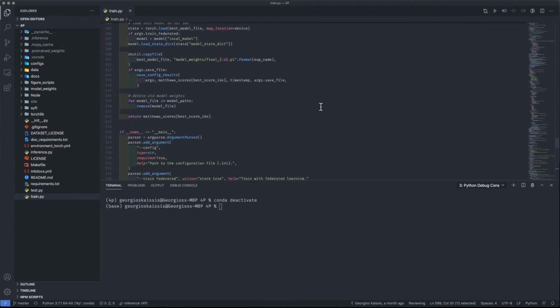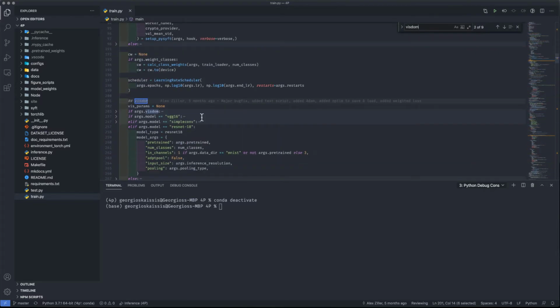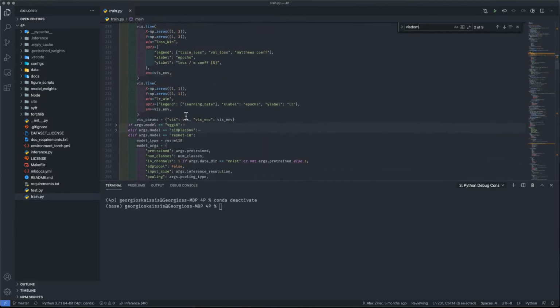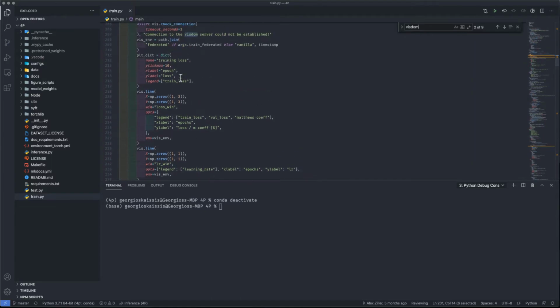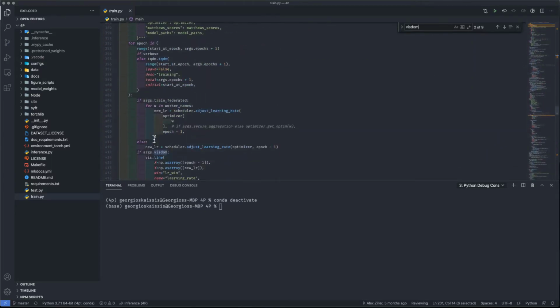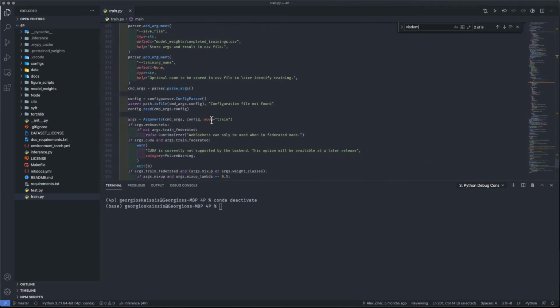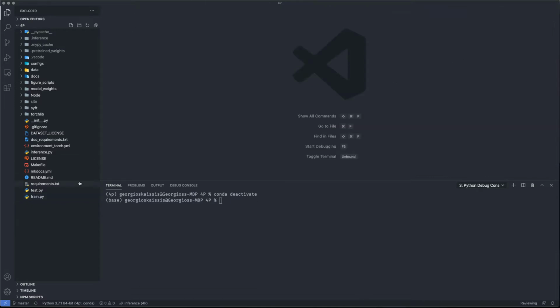training monitoring with Visdom, which is this nice library. Let's see where it is, Visdom. Yeah, so you can actually fire up this Visdom server and it can monitor your training, and it's implemented for these various models here. And last but not least, we've got this main block here, this main clause. This is essentially where all the magic happens. And so that's the train module or script, I guess.